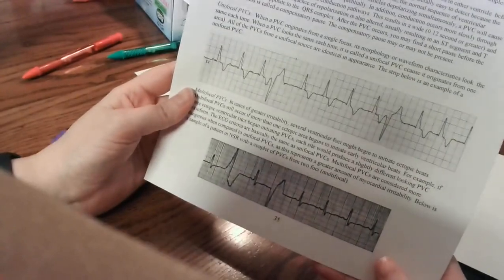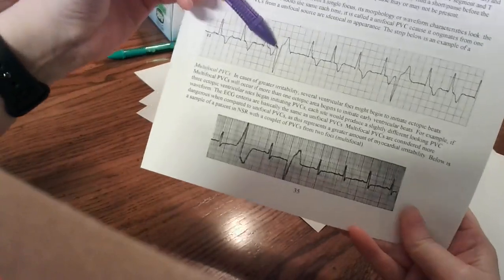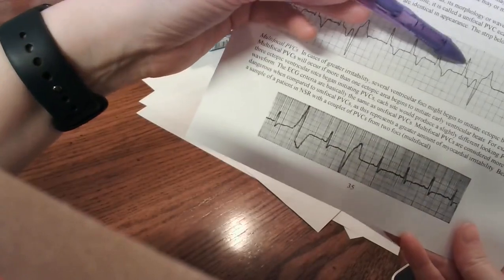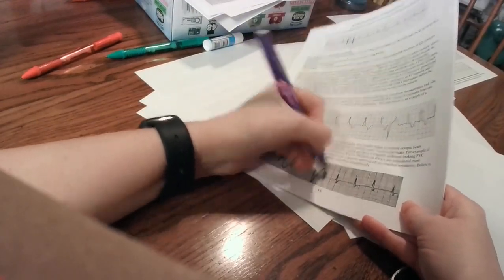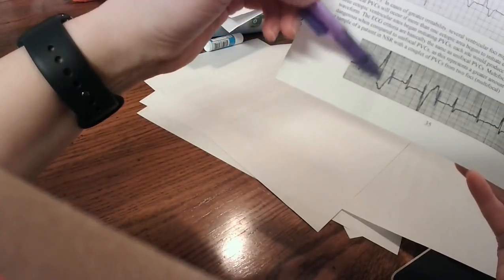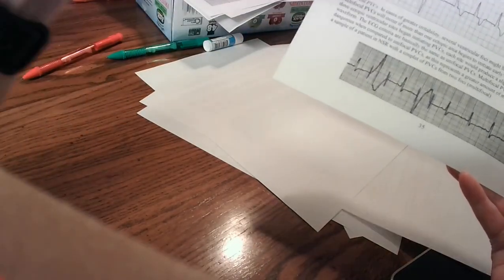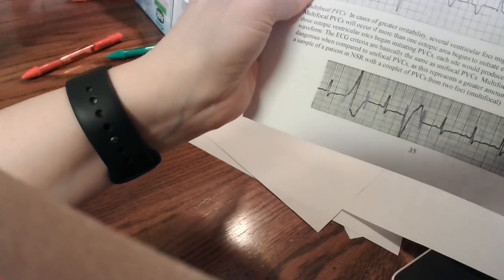And here there's a multifocal. Because I was going to say this is unifocal again. If you look, same. And then these are the actual real beats that are doing something and coordinated. And then the multifocal ones will be really wide, like these guys, but they won't look the same. So that's coming from one part of the ventricular area, and this is a beat that's being born in a different part of the ventricular area. PACs can do the same thing. It'll just be on the atrial side instead of the other. Let's see what else we've got in here.